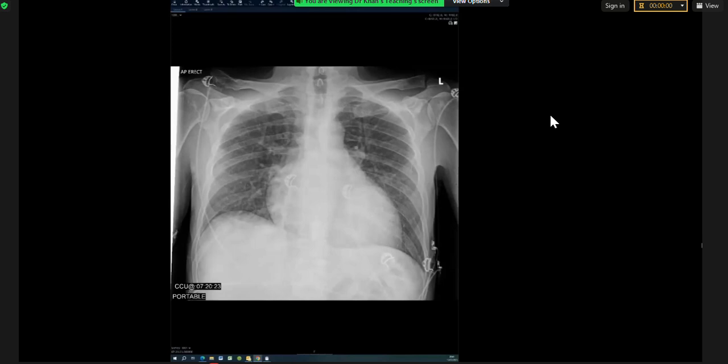You need to see reduced lung volumes to go down the ILD route. If you have general haziness, you need to talk about pneumonia, or if in doubt, pneumonitis is a good word, because pneumonitis doesn't really commit to infection or idiopathic process. Because in the beginning, ILD, like drug-induced, can look like pneumonia. So pneumonitis is a good word to get out of that situation. But differentiating ILD from pneumonia is a long conversation that we can probably pick up another time.